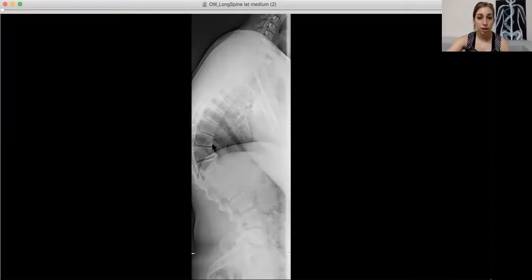The marking characteristic, which you can't see very well in this image, is little notches in the vertebra. This one, it's not very clear. Sometimes you can see really big notches, but it's characterized by a really large rounding happening in the mid-back. The Schroth method is very good for kyphosis and Scheuermann's kyphosis as well. If you see on your x-ray that you have some kyphosis, or especially Scheuermann's kyphosis, that's what they're talking about.